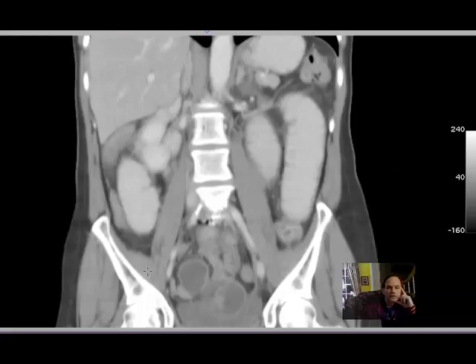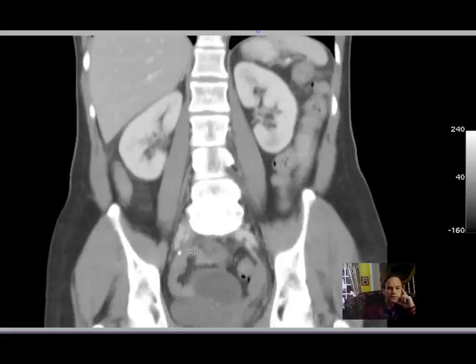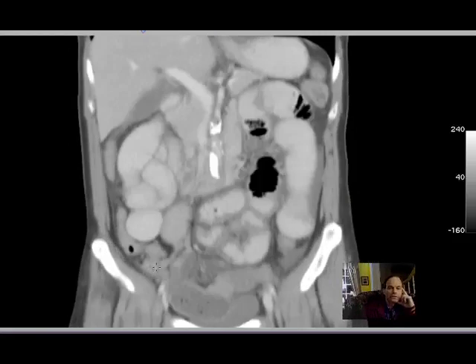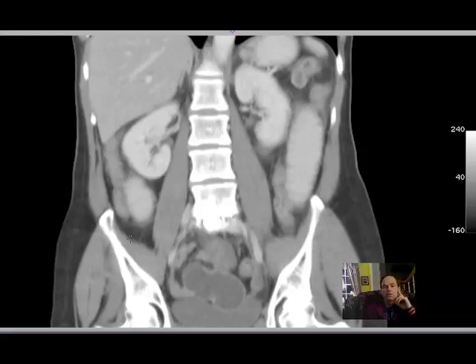But you see a number of structures. Yeah, that's small bowel. So it's coming out of the pelvis here, and it kind of courses up. So this is small bowel right there. This is small bowel here. So it's really quite narrow, and then it comes into the right colon as a terminal ileum. So clearly a reduced caliber of distal small bowel and of colon. Very important. Very common thing to look for. These findings are really as clear as any you will ever see in this regard.